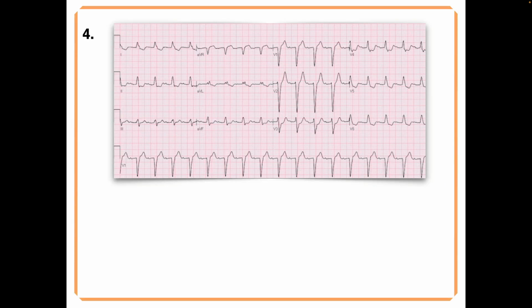So Grace, number 4, please. There's a left bundle branch block. Looking at V1 through V3, it goes down and then up, but V3 stays depressed and never goes up. So we're calling Sgarbossa B in V3.